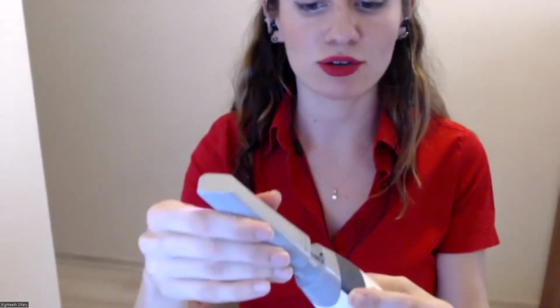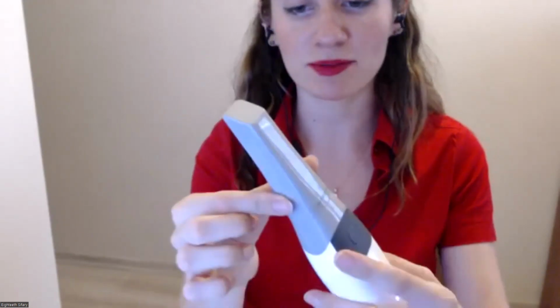These are the lens, which are like a mirror or our eyeglasses, so we need to be very careful. We don't want to get scratches on this. So please always make sure you insert the tips in a correct way, like this.